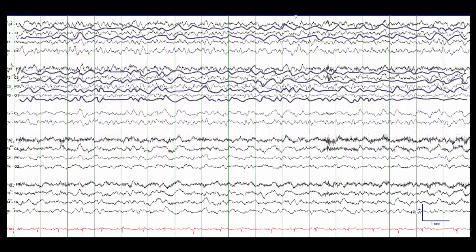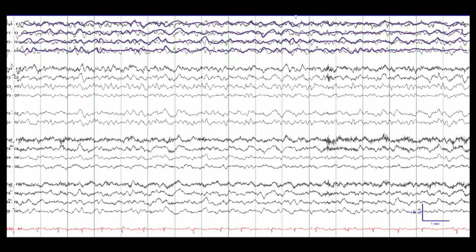In this example, continuous right hemispheric, temporally maximal delta slowing with field to right frontal region is compared to its homologous region over the left hemisphere. It is important to note that the theta band activity seen over the left hemisphere is representative of the patient's slow, encephalopathic background, rather than separate focal slowing in that region.